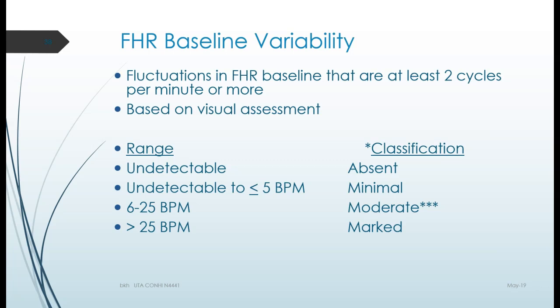This is not a good thing. We need to do something about this. Minimal and absent. Absent, that's probably always going to be a hypoxic kiddo.